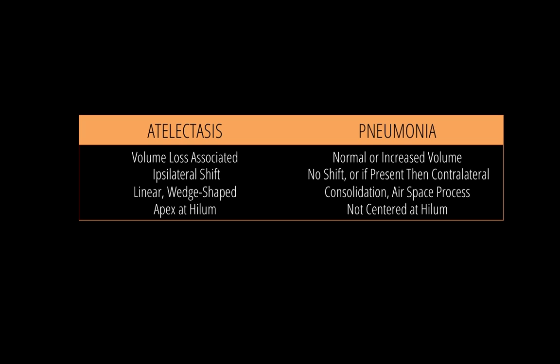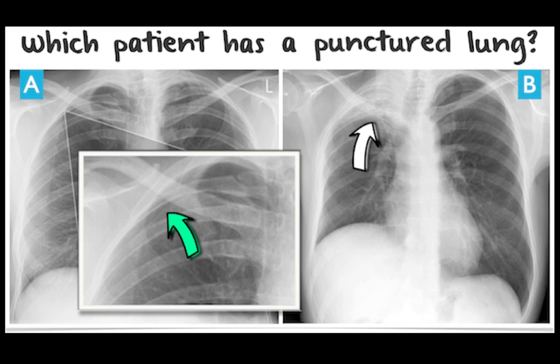However, if it is present, it's usually going to be to the contralateral side, so it's going to be pushing rather than pulling. And then lastly, it's not going to be centered at the hilum. So I'll give you a second to try and interpret these two radiographs.